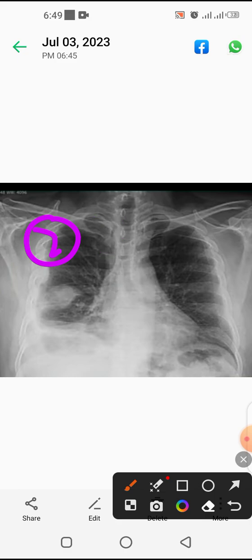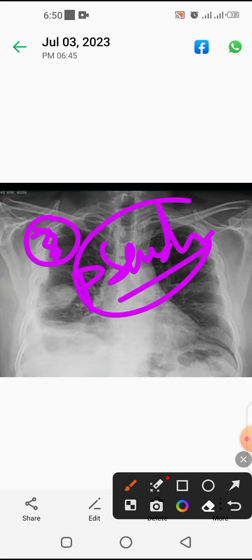Now the third differential in this case would be, if a patient is having opacity and he's having effusion on this side, the third differential will be pseudotumor. Yes, pseudotumor. This can be cardiac failure, and this is opacity. This is the fluid in the fissures. Whenever there is fluid in the horizontal fissure, it looks like that. So effusion with opacity in the horizontal fissure, you should think of transudative collection of the fluid.